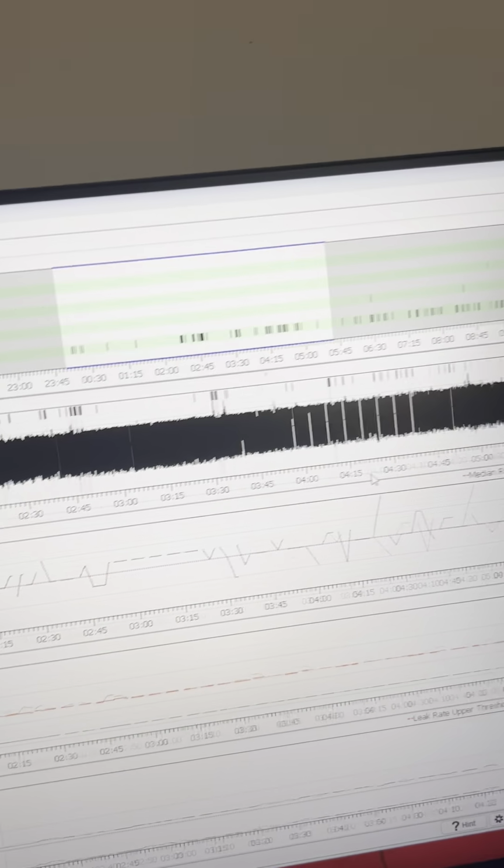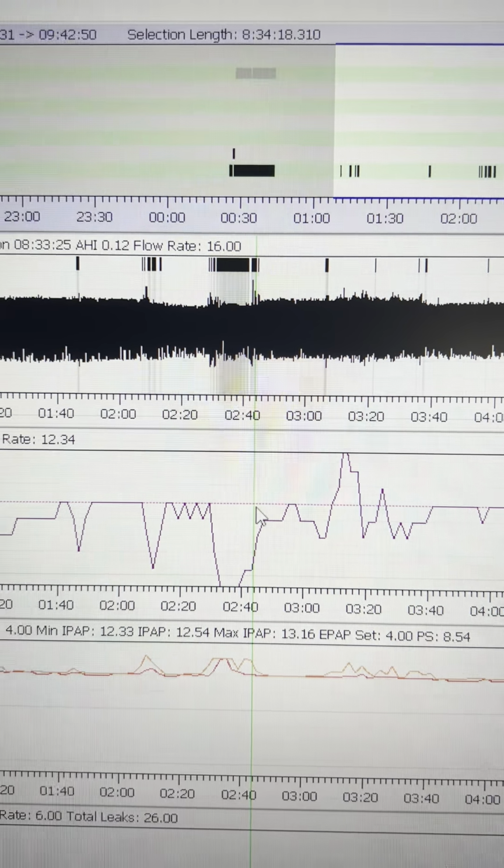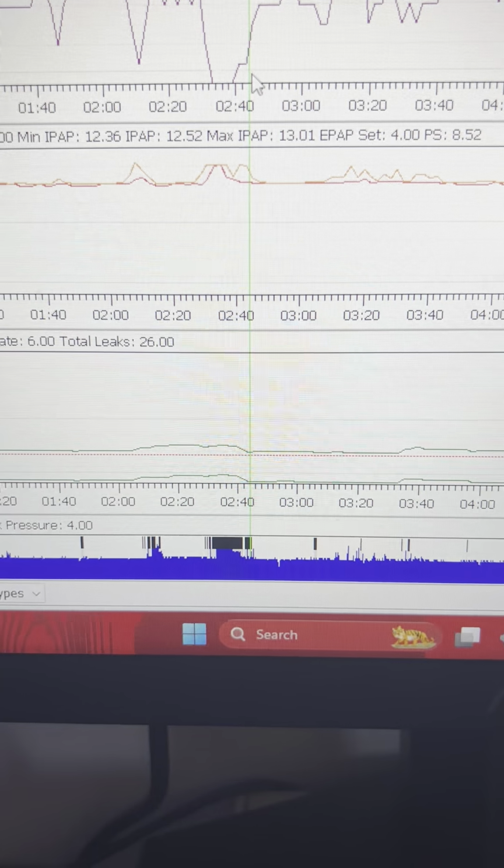Just normal, boom, under ventilating randomly. And here there was already a leak going on. So after a while, all of the CO2 leaked out basically. I don't know why that happened, probably with my mask just going off or something. Here it's stable again. What do you see? It goes stable again. So right here, just at the end, all of those, just no leak. There we go. See? So that's what leaks can also do.